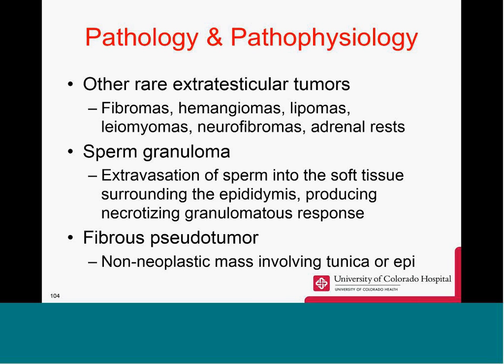Sperm granulomas are an extravasation of sperm into the soft tissue surrounding the epididymis. This produces a necrotizing granulomatous response. These are often seen in a post-vasectomy patient. And then fibrous pseudotumors. These are non-neoplastic masses involving the tunica or epididymis.